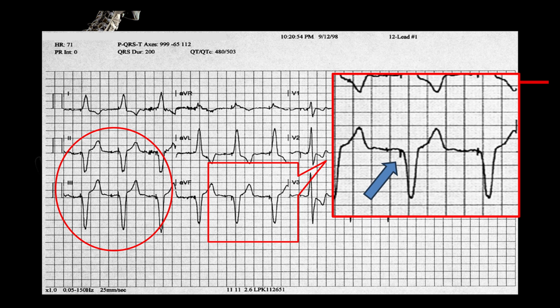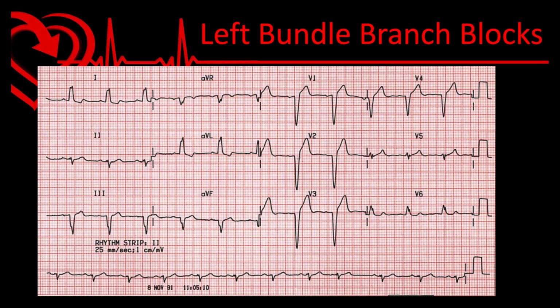So that wide QRS is a ventricular conduction pathway that's being triggered by an artificial pacemaker, and because of the odd wide pathway of the electricity through the ventricle, it is likely to produce odd and different ST segments and T waves. And in this case, it appears to look like ST elevation, which it is, but it has no significance in terms of an MI. It's simply a reflection of an altered electrical pathway through the ventricle.